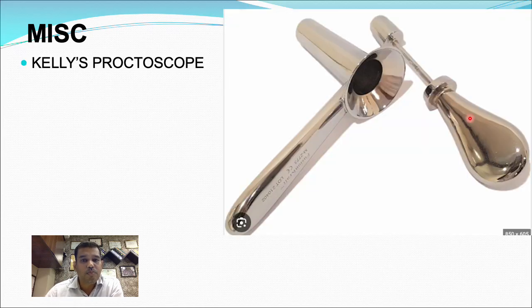Now coming to the miscellaneous instruments. One is Kelly's proctoscope. This is obturator. This is proctoscope. So this is used to do proctoscopy in OPD basis. So in OPD, when you have a patient with some anorectal disease, as in bleeding PR, perianal pain, or some mucus discharge, or something coming out per rectum, in that case, to examine the patient, you use this instrument.